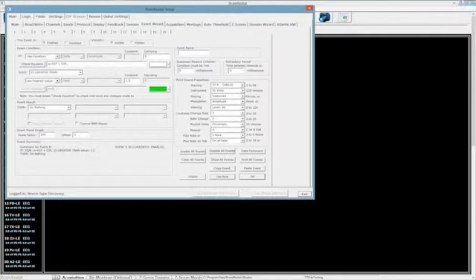And if I get a value of 2, then this event condition is true. And if this event condition is true, well, then I'm rewarding everything. My people can watch the MMP player, they can play their Flash games, and they can do some other things that are actually really cool too. And you might have noticed me jump real quick all of a sudden to event 12.